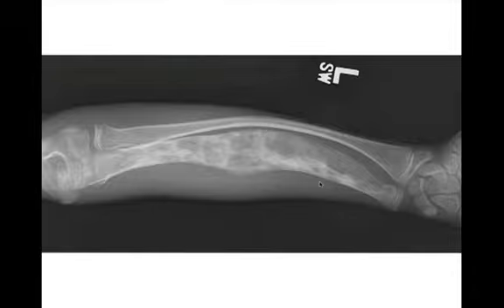This lesion really takes up the whole of the ulna. It's really involving the whole ulna. Notice there is this bowing deformity. So it's still a geographic lesion. It's mixed lytic and sclerotic. It has a narrow zone of transition. It's centrally located in the bone, predominantly in the diaphysis. Probably stops right about here and goes to here, and some of the metaphysis.